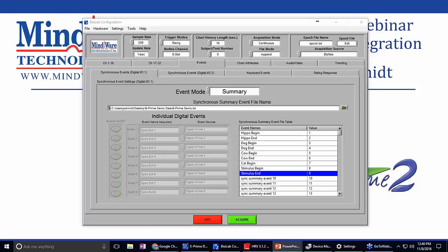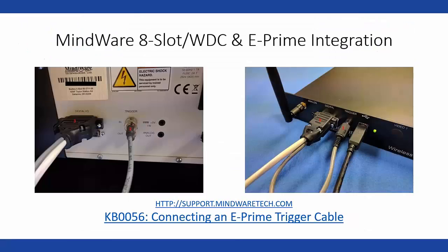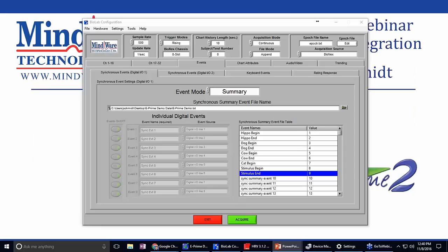So this is what I'm talking about: right here you can see we have this connector plugged into the first port up here, and there's also one right below that you're not seeing. If you wanted to switch, you would simply switch them over. But for this instance, we're going to keep it on 1.